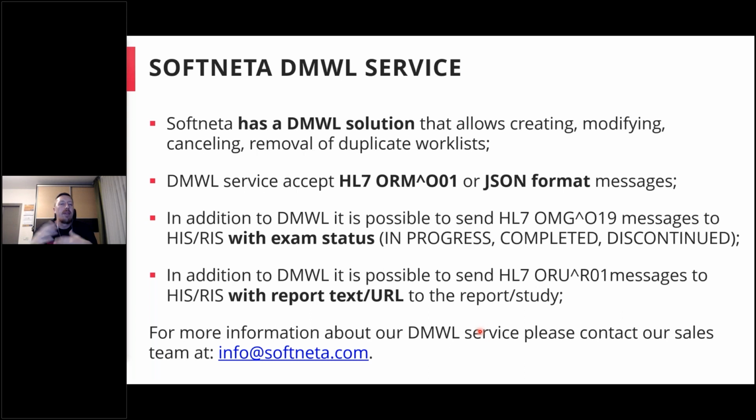So if you need a more complex, more dynamic solution, our DICOM modality worklist solution would allow you to create, modify, and cancel the worklist. Also, it would remove duplicates of the worklist if such scenarios appear.